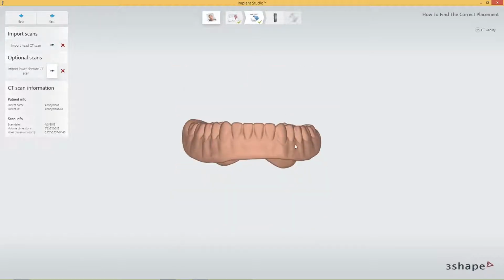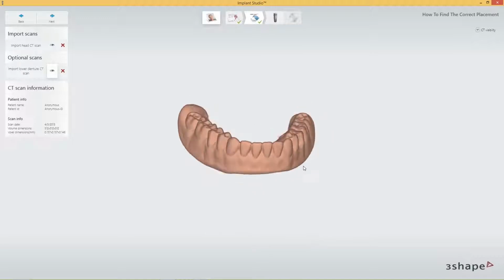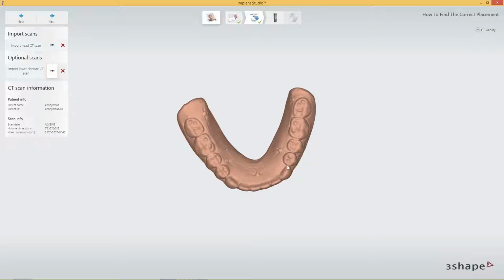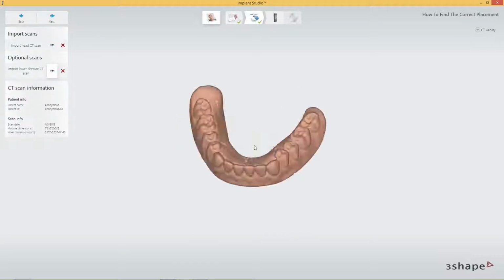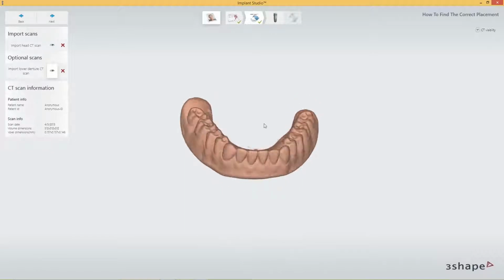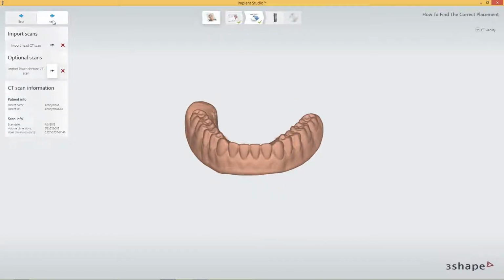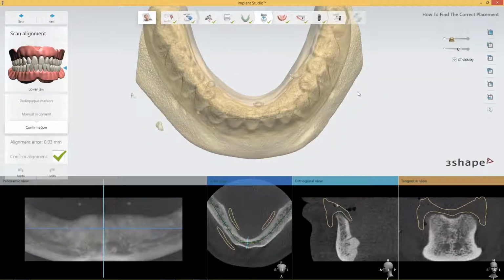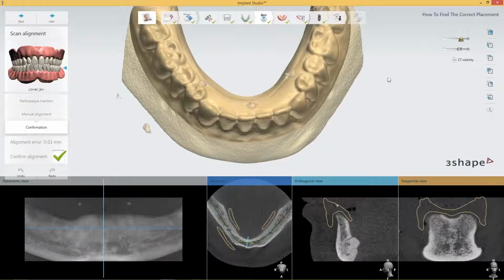There we cover the dual scan protocol, where we place the denture with the markers inside the patient's mouth, take an X-ray, and then X-ray the denture again without the patient. By doing that, we can combine the 2 images, and we get the exact positioning of the soft tissue, and we can also use the teeth from the actual denture to place the implants.